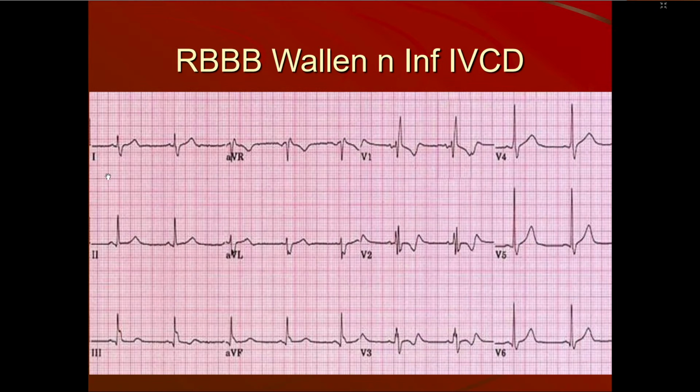Now this one, lead 1 is isoelectric, AVF is positive, and there is the interventricular conduction defect out here. So causes of right axis deviation, one is right bundle branch block, look for it. RS pattern, concavity upwards, T inversion, ST depression, and T inversion. So this is a right bundle branch block and some IVCD.